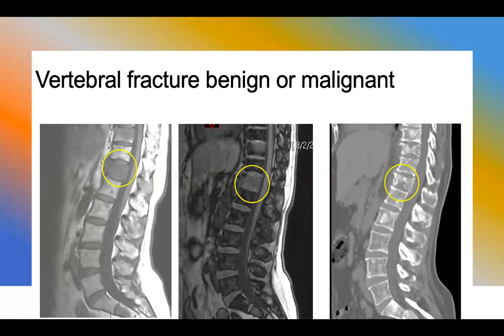So these are highly suggestive of that being a pathological fracture.